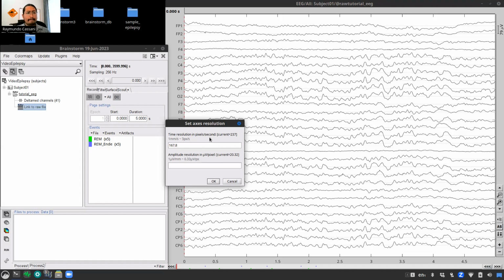However, the ratio between pixels and millimeters can change with the size of the monitor, of course, and with different operating systems, if there's some scaling done. So the best way to get 3 centimeters on the monitor properly is to use a ruler and measure.